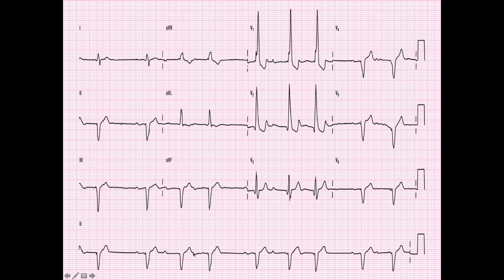And then I've got this one where the P wave is actually starting to get buried in the T wave, so it's long, but it's even longer than the second one. So where you've got this progressively lengthening PR interval, and then I've got this P wave buried in here, buried in the T wave.